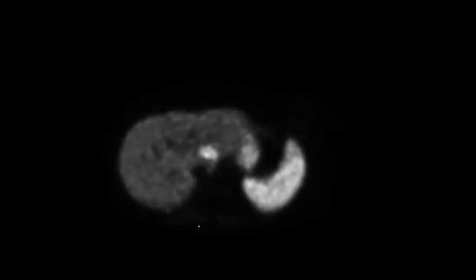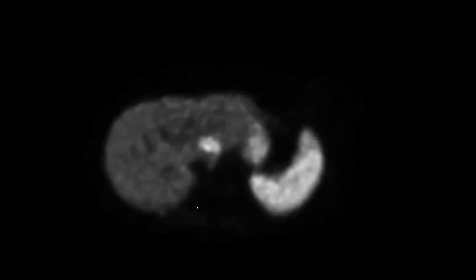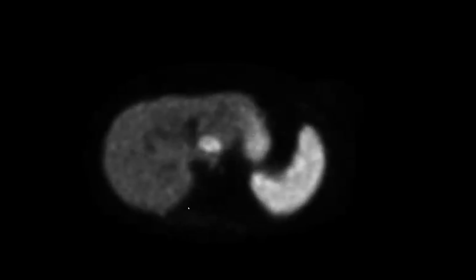I think this is a pitfall. Sclerosing mesenteritis doesn't look like that. It's not a mass lesion. Well, it can be mass-like, but I think one pitfall in this case is that the T2 signal is so different in the two areas, right? In the mesenteric lesion, it's dark, which is unusual for neuroendocrine, and then in the liver, it's really bright, which neuroendocrine can do, but it doesn't always do. So they're discordant. Right. So this is, anyway.